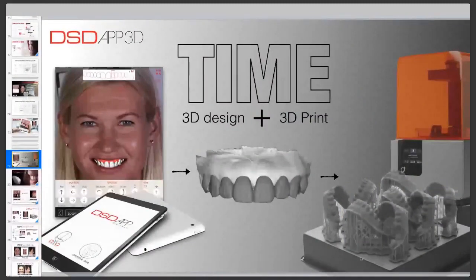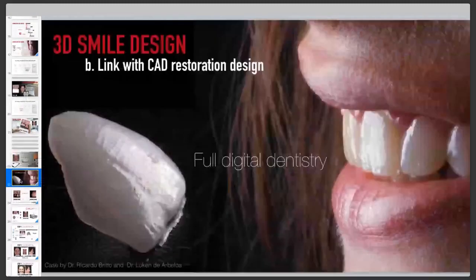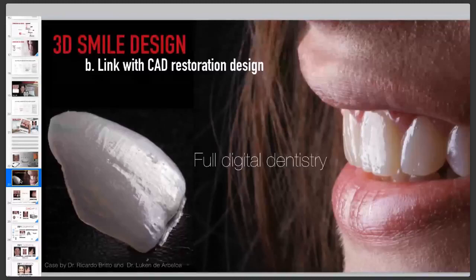All the files from the DSDApp are open, so they can be continued in any CAD software. As I said at the beginning, the app is really a bridge to full digital dentistry, where we store the files from the beginning, we share these files properly, we motivate our patient, we create 2D simulations, and we guide the treatment for different specialties based on aesthetics, as in the principles of DSD.